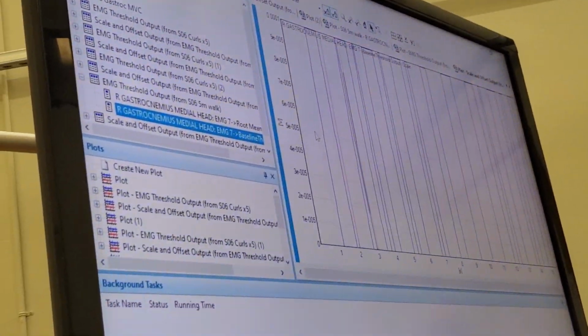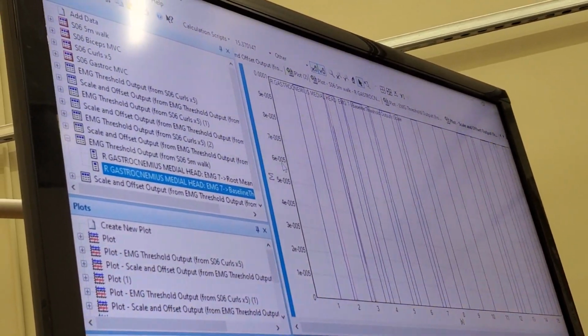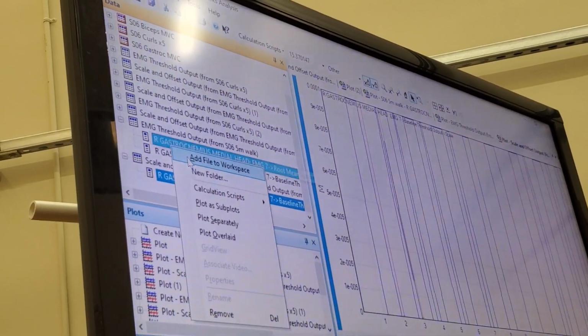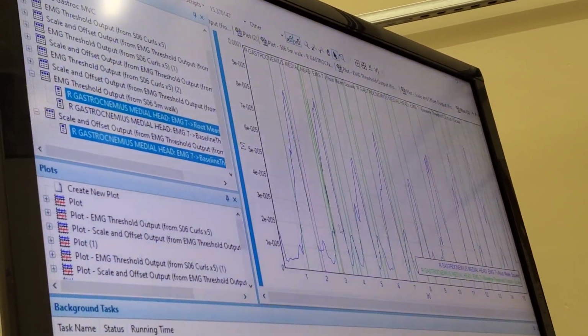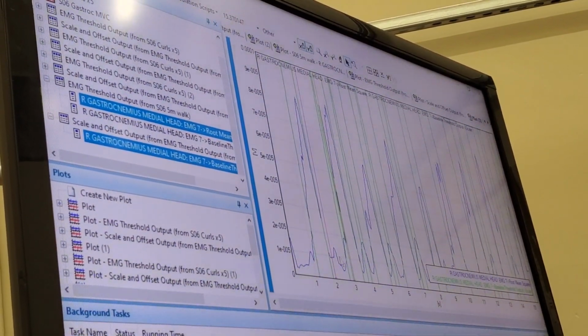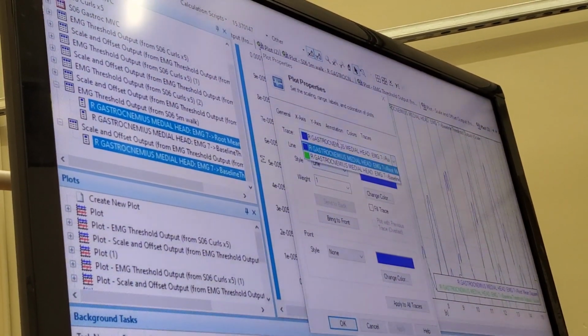Notice that we're getting a lot more than we expected, than we want here. Let's plot overlaid again. So we're getting some of these random spikes that are showing up in our trace here.